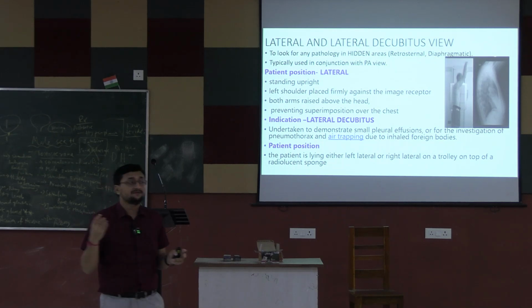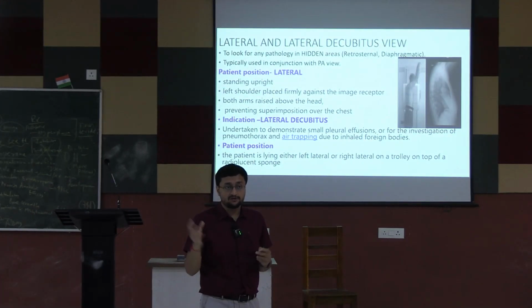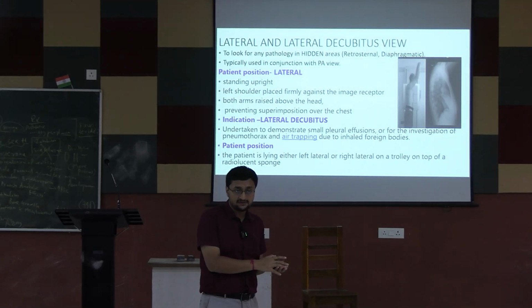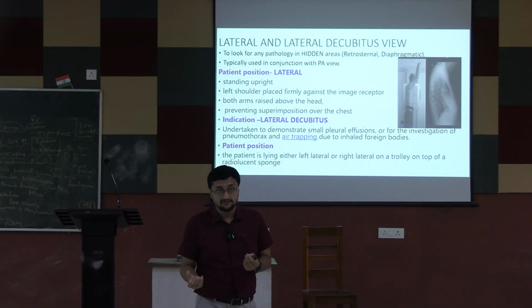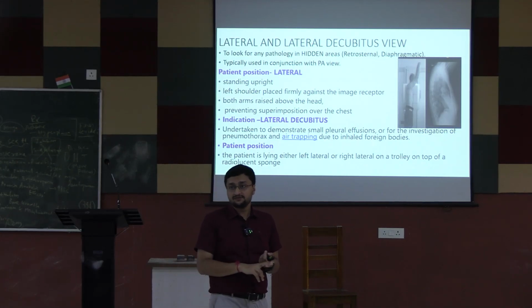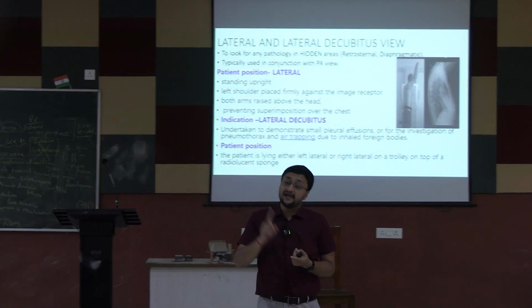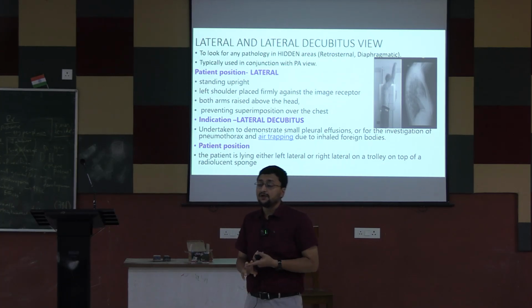But in case of intubated patients or those kinds of patients who cannot stand, who are critically ill, then you have to do X-ray on an urgent basis. Then you cannot ask the patient to stand, right? So in that case, AP view may be ideal.